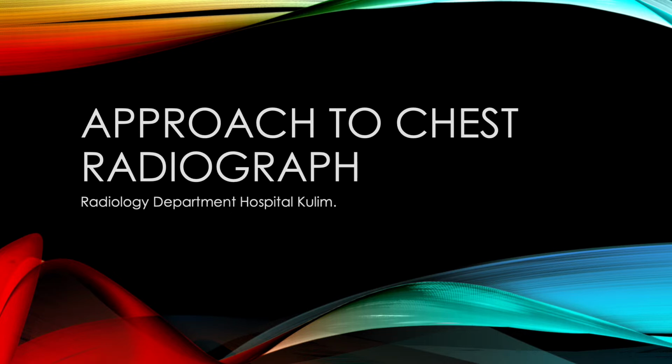Chest X-ray is the most frequently requested radiologic examination. The interpretation of a chest radiograph requires the understanding of basic principles. In this presentation, I will focus on the systematic approach to the chest radiograph.